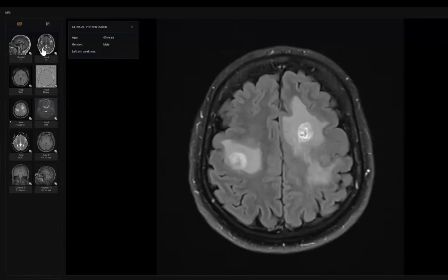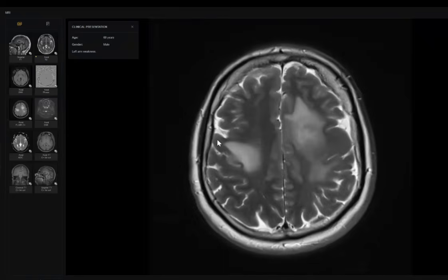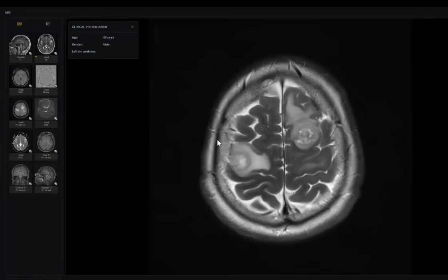Too difficult. No, sir. Especially, I will also check. You talk about abscess and metastasis, and you didn't ask for MRI. Okay, let's talk about your differential, abscess or metastasis. You compare between tumoral pathway and abscesses. Which sequence do you want? DWI to check restriction.